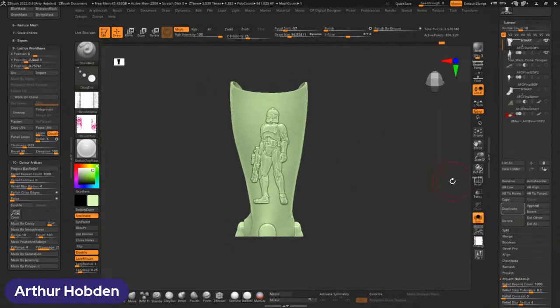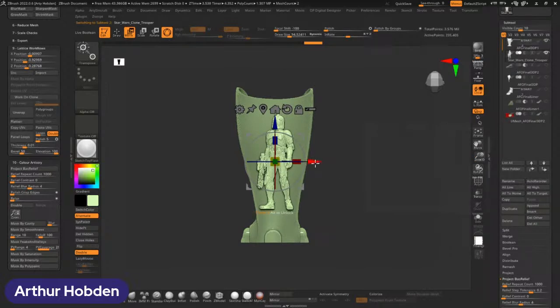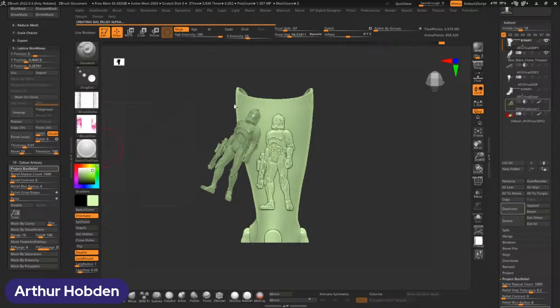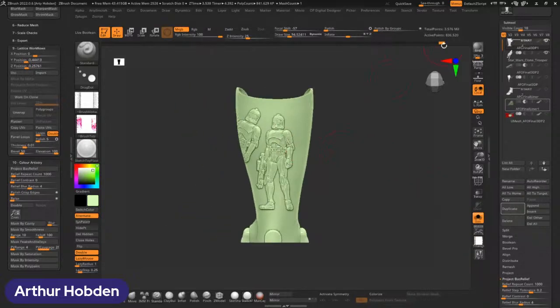That's on. You can go and take that same model, move them around again. Same thing, project base relief. If we go back to this, we can project the same model again. So you can get a collection of toys, line them up in a cool little headshot or some sort of title, and you can throw those down onto the image.